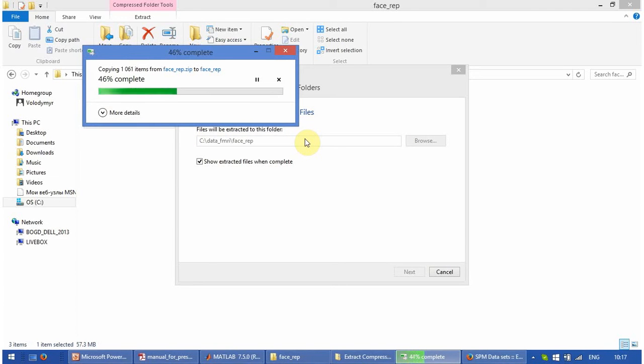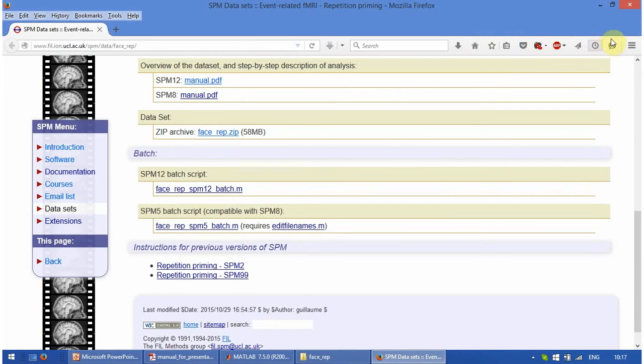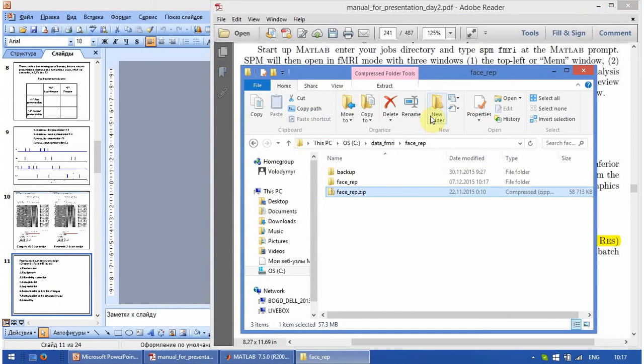Takes a few seconds. The browser can be closed.